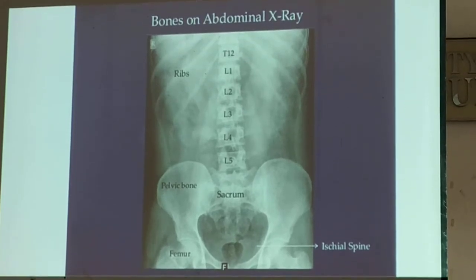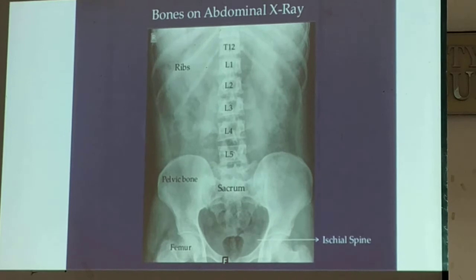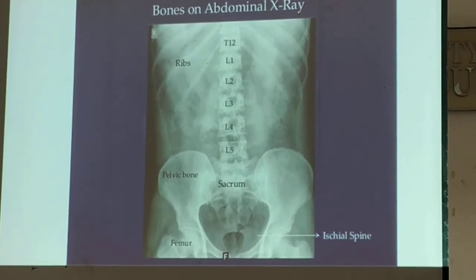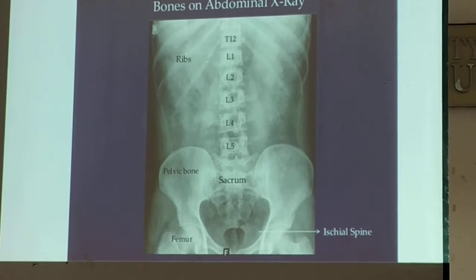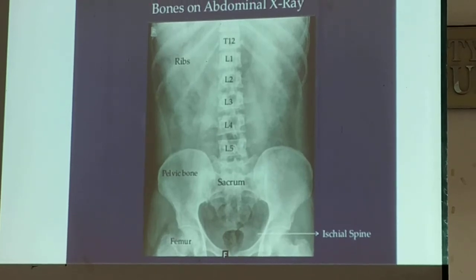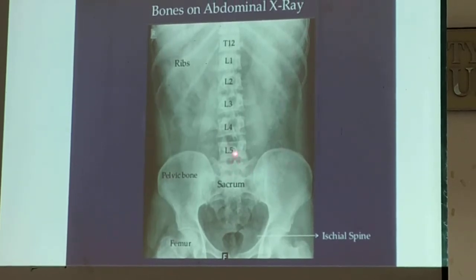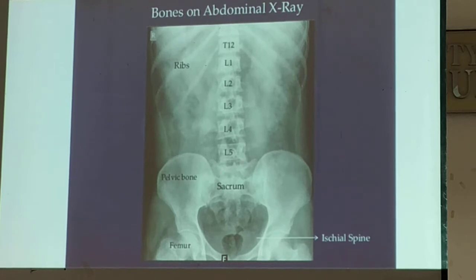Okay? Seldom do we see radiographically the absence of L5. Okay? So, in almost all, L1 to L5 is complete. So, even if you cannot see it, that would be L5, and then next to L5, that would already be your sacrum. Okay?